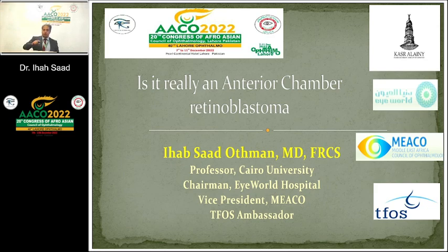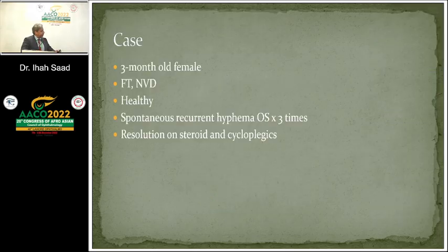Yeah, I think you saw the very thick viscid subretinal fluid, and I don't think there is a way for the RPE to absorb this. It's very difficult. I think at one time it had to be drained. Anyway, in practice we encounter unusual cases.